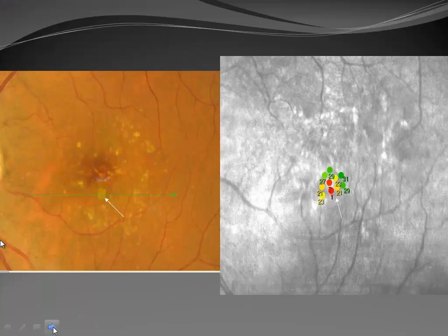And over here, we have that horizontal slice right through that area where there's tissue missing, this small area of geographic atrophy of the retinal pigment epithelium. I was able to click that twice on the scanning laser ophthalmoscope image, and you can see those 2 points have extraordinarily reduced sensitivity. The points around it have fairly normal sensitivity in green and somewhat reduced sensitivity in yellow.